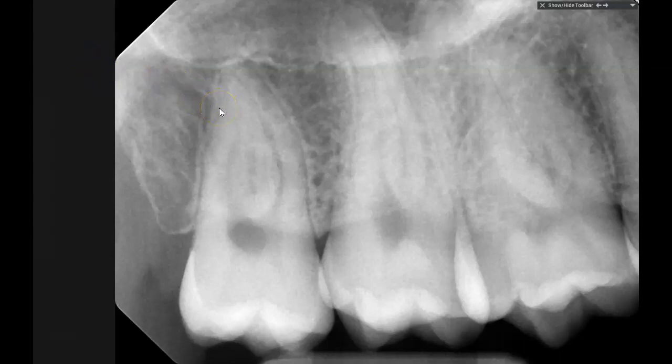First thing that you notice is, wow, amazing how huge that image is, and there is no capacity for that to be changed to any other size. You get full screen or you get thumbnail, but nothing in between as far as a size allowance.